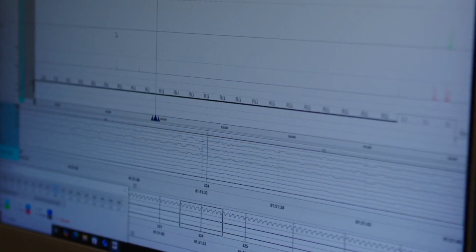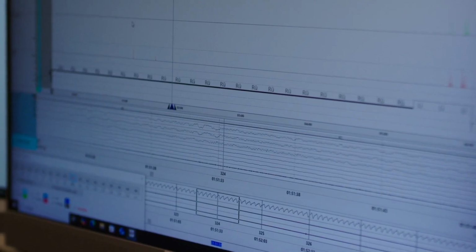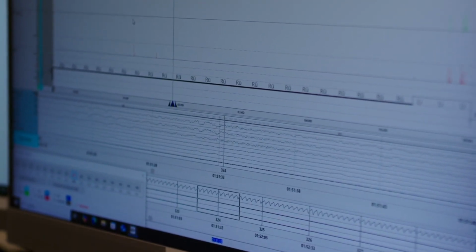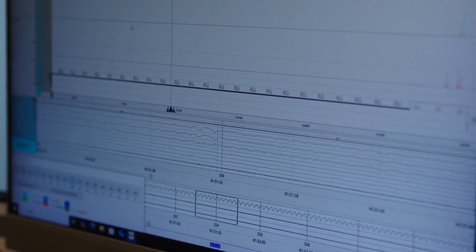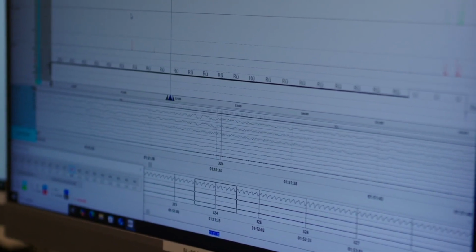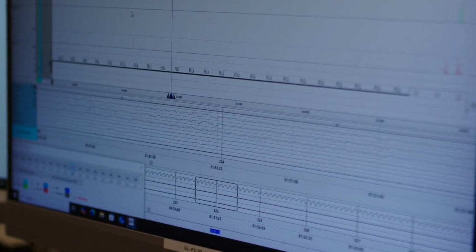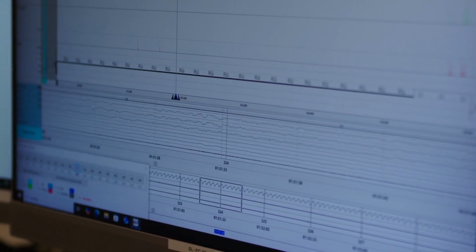But what this actually looks like in reality nowadays, we will now look at again in the sleep laboratory in Bolzano. Yes, in the last episode, we briefly mentioned the sleep profile. But Heike, now you can explain to us right here on the computer how the sleep profile is composed from what you evaluated and what picture emerges from it. Okay. I've now evaluated 935 pages individually, as we said, in 30-second epochs. And that results in this so-called hypnogram.